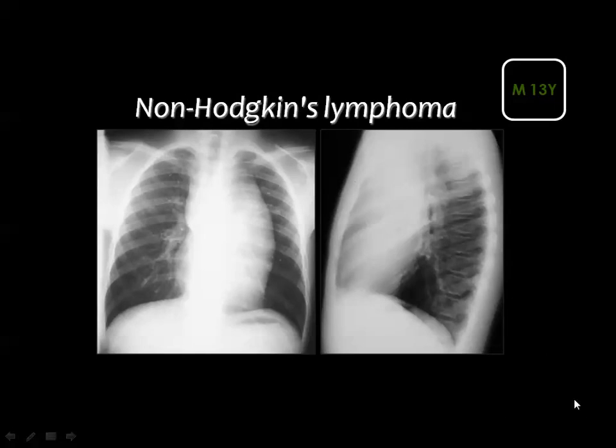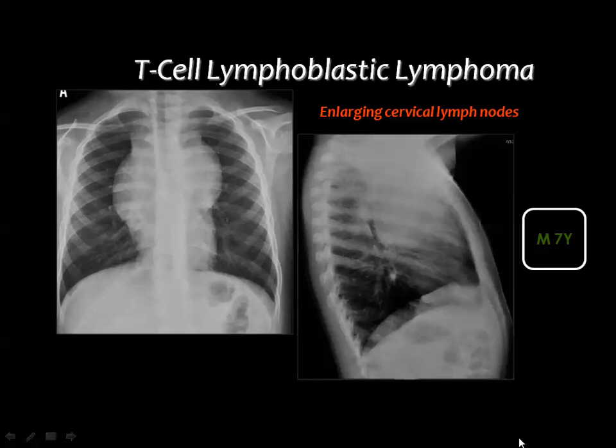In this example, there is a broadening of the mediastinal shadow. And you see this lobulated margin of the left border and also of the right border. In the lateral view, there is a big soft tissue opacity which is located in the retrosternal area.